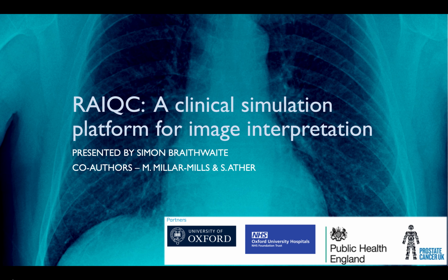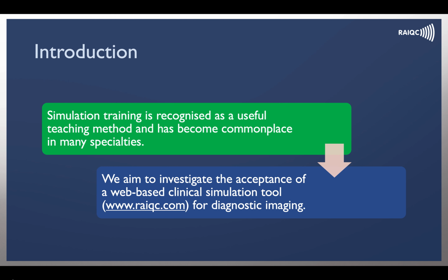My name is Simon Braithwaite, and today I'm going to be talking to you about RAIQC, a clinical simulation platform for image interpretation. Simulation is now a well-recognised teaching method and has become commonplace in many specialties. Today, I'd like to introduce you to a new web-based clinical simulation tool for diagnostic imaging in the specialty of radiology.